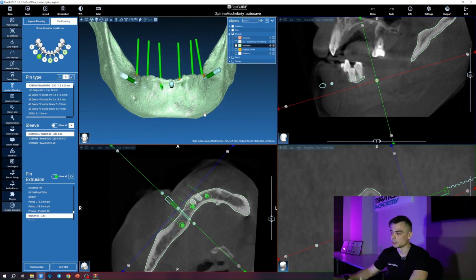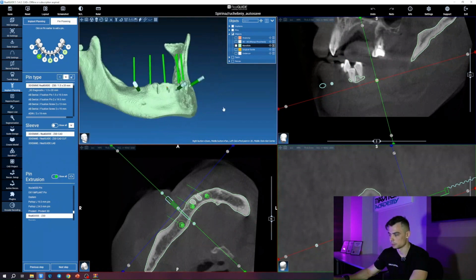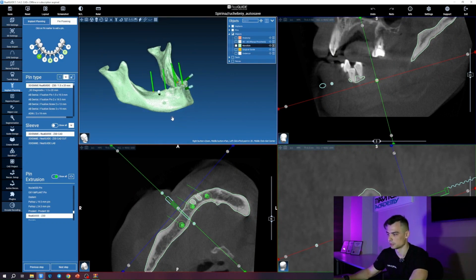Basically, this working area can already be left as it is. There you go. That's the first point I wanted to mention here. As for segmentation, I'll talk about that a bit later when we actually start making the template.